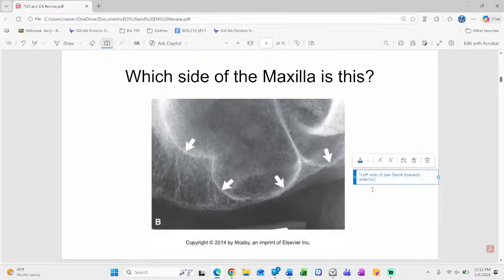What else is another hint? What is this? Coronoid, right? You're only going to get the coronoid then because the mouth is opening and the coronoid came forward. So there's another hint for you. Of course, we know the sinus isn't going to take over all of the maxilla because you have a nose. So it's going to leave some bone, typically around that canine, maybe this was first premolar area, that there's typically some bone sitting there. Good?